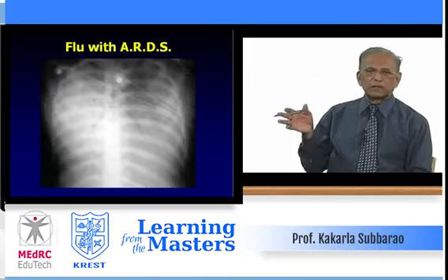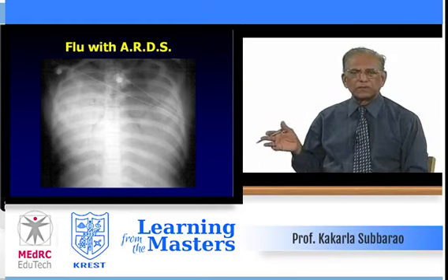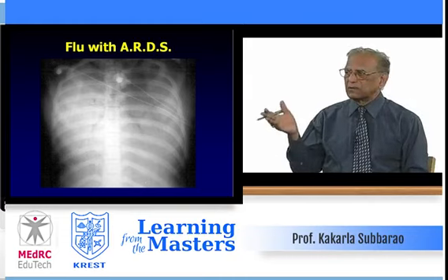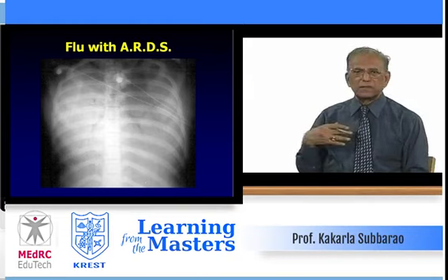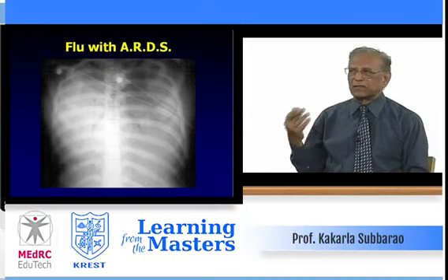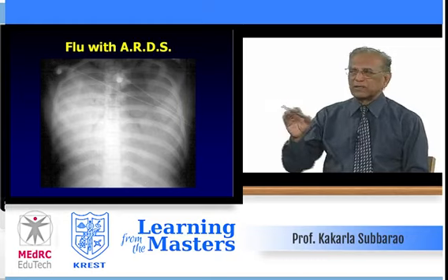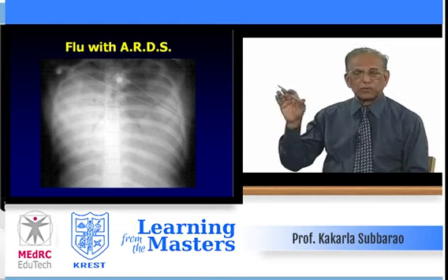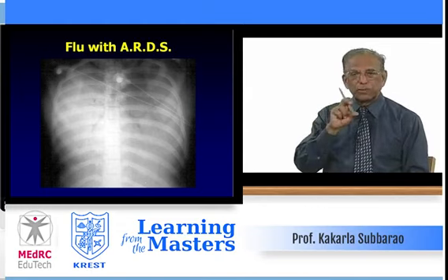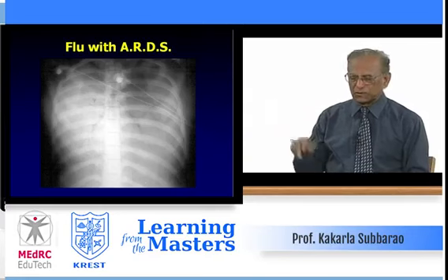I remember this young girl, about 16 or 17 years old, who came with breathlessness, dyspnea, palpitation. And when we saw and took the film, already both lungs were in respiratory distress syndrome. She was on a ventilator. And you see the air bronchogram in the consolidated lungs. This is one of the pictures of the entire spectrum. ARDS, acute respiratory distress syndrome.